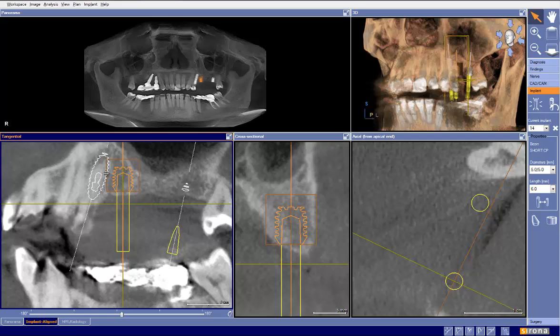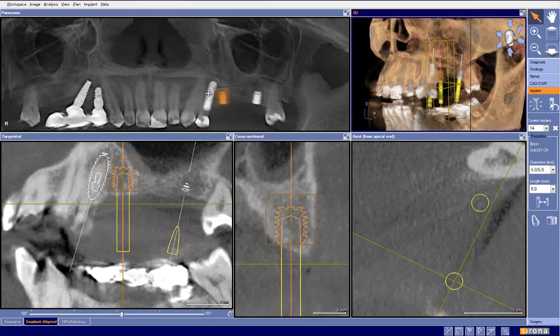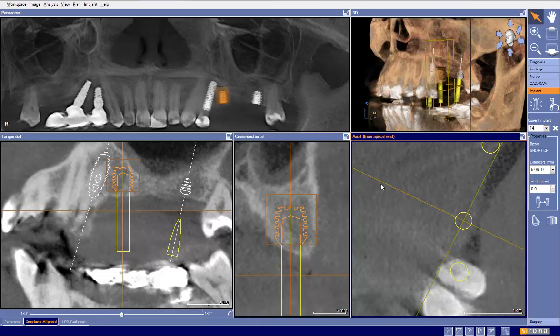Now the bigger issue is going to be, can we place this implant in a position that allows us tooth number 12? So we may have to go back to number 12 and adjust our plan there. If we really take a closer look, our real issue here isn't number 12, but it's actually number 11 with how distalized that root is. For whatever reason, that's really causing some trouble for us. So this may be a situation where we look at doing more implants and then doing a cantilever for number 12 so we can get the implants more parallel.